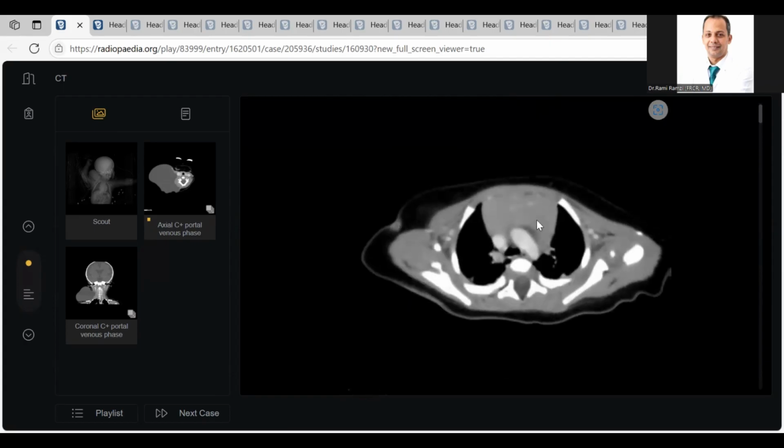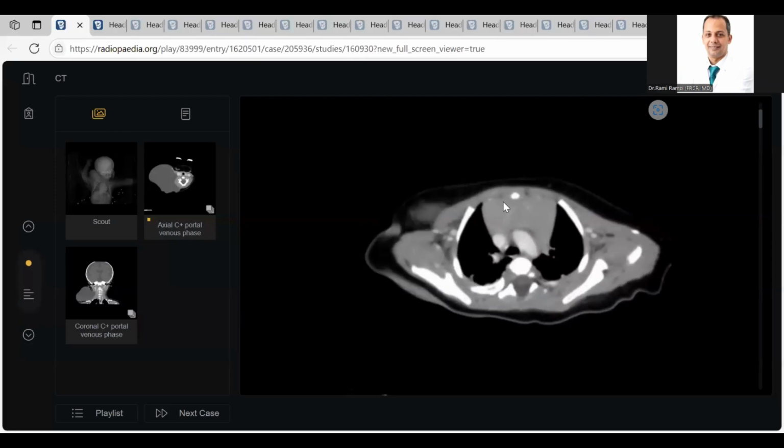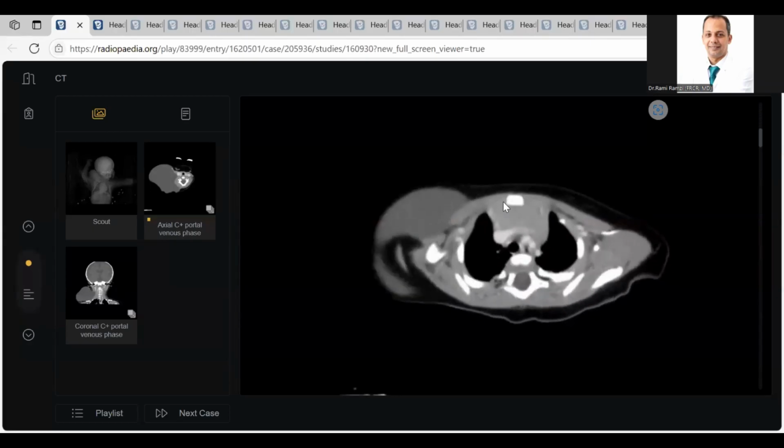This is the thymus, my colleagues. Please, in younger age, under 2 years, especially, the thymus must be huge. Don't talk about it, please. Even in X-ray, we should later on do one pediatric session, and I will explain especially about the thymus because it is confusing. Thank you so much.